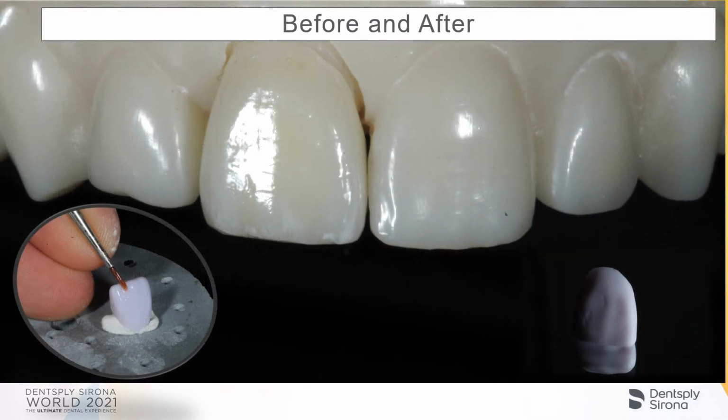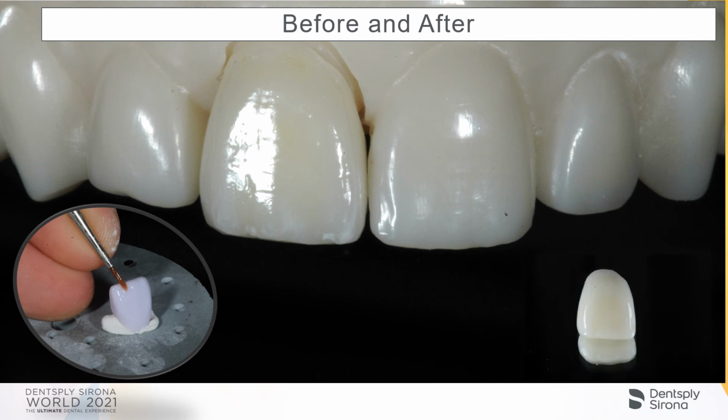So now you can see, using a very small paintbrush, applying our glaze first, and then applying those subsequent layers over top. On the right-hand side of the screen, you can see what came out of the mill. Something very rough, had some burr marks on it. Overall, a very ordinary looking restoration. By the time we get done, you can see how extraordinary this restoration can become by just looking at the 3 C's: our contours, our consistency, and our color. We're developing our shade map, our topographical map, because we've recognized some of the anatomy and some of these things that we see in the natural dentition.